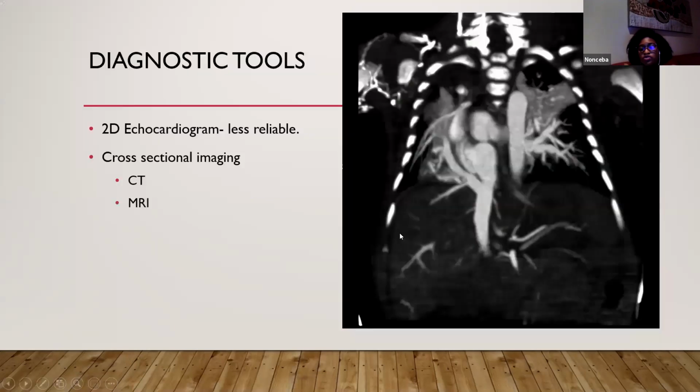into the right atrium. Then we did a CT angio, and this is just a reconstruction of it. As you can see here, this is the right, that's the left side. And here is this consolidated lung, which has abnormal vessels. And this vessel is going down under the diaphragm into the IVC, and only then draining into the right atrium.